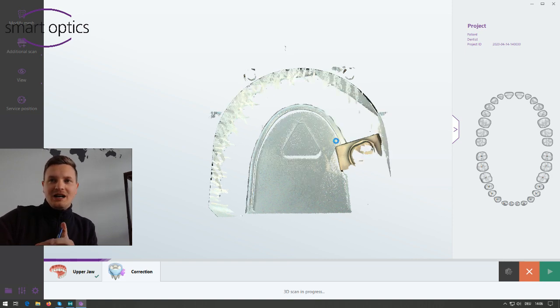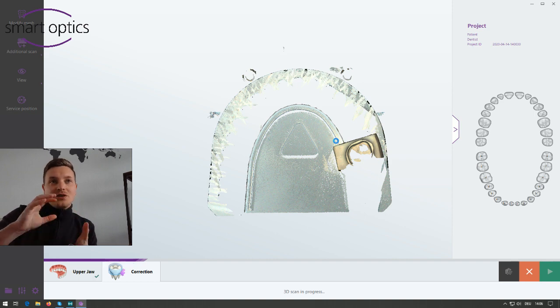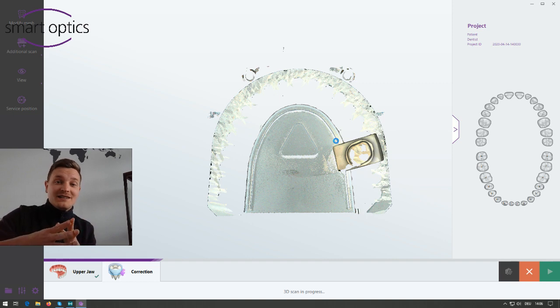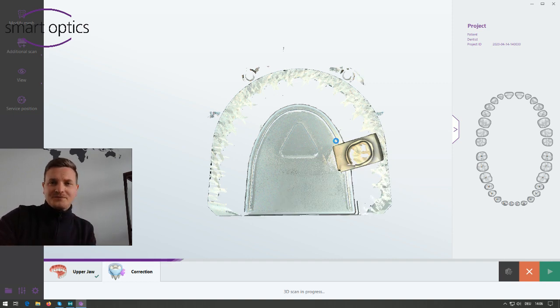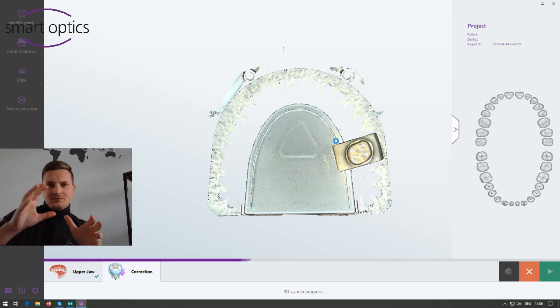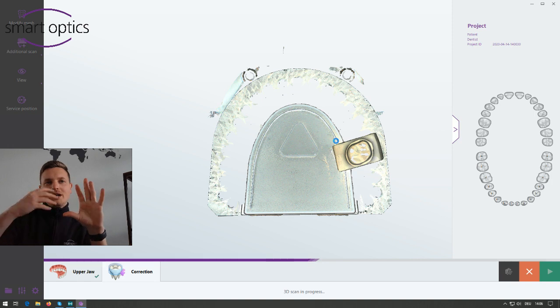And then after this step is matched, we are able to do the correction with the multi-view registration. The multi-view registration I already explained, I think two videos before, that it's always important to move both. You have the split screen, and it's important to have both objects inside the same view. So move both objects from the top, for example. Then the registration will be successful, of course. If you have it the other way around, it won't work.